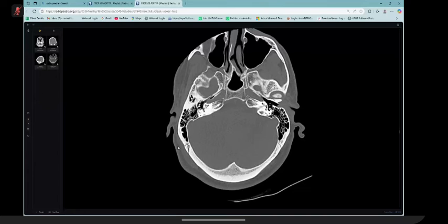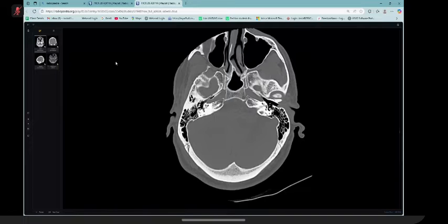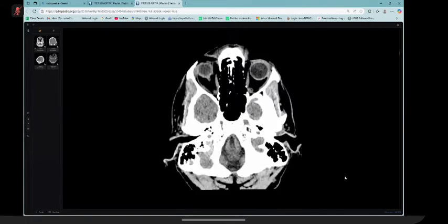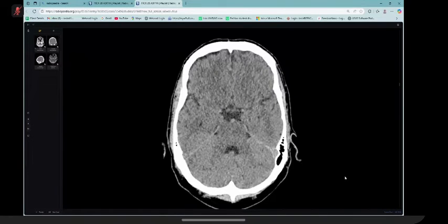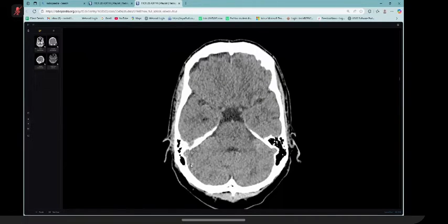This region, can I go for the soft tissue? Yeah, take whatever you want. Axial windows again, because I appreciate that there is some asymmetry seen in the bones in that region of the right occipital bone. And there was some hyperdensity in the right mastoids as well. And I'm concerned for some heterogeneous foci, hyperdense or hypodense, in this region.